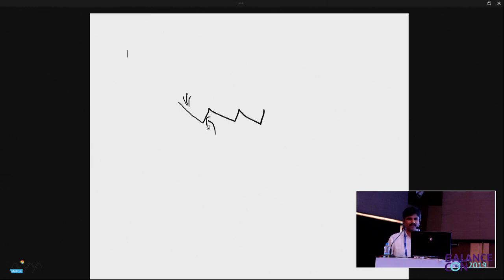So we see this. Sir? A little comment: the horizontal nystagmus seen here is direction fixed. Yes, sir. So it's not from optokinetic; it should not change in the opposite direction. Yes. That is what Dr. Alfargal is pointing out, and that is why we have included two. Just see the next one. Even when it is top to bottom or bottom to top, it is still left beating. The horizontal component is still left beating. Because of that, it most likely represents an underlying vestibular tone asymmetry. So this is the kind of information we get.